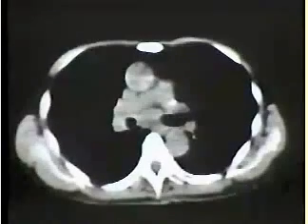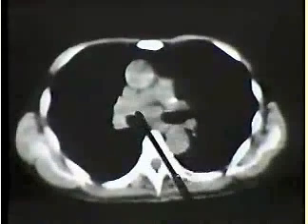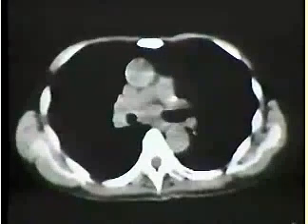Let me show you a couple more examples. Different patient, a very nicely demonstrated subcarinal lymph node, also metastatic. There's also some tumor encircling the bronchus intermedius here. Fat, again, of normal distribution back here, and then esophagus. This is only visible clearly on a CT scan.